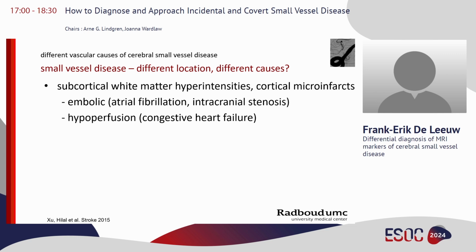So just over the course of 14 weeks, 3 months, this patient experienced, so to say, a shower of white matter lesions without any symptoms at all. Isolated focal white matter lesions in the subcortical areas. Over 10 of these in 3 months. And if you look at these lesions, it's hard to believe that this is intrinsic small vessel disease. Obviously, it can play a role.